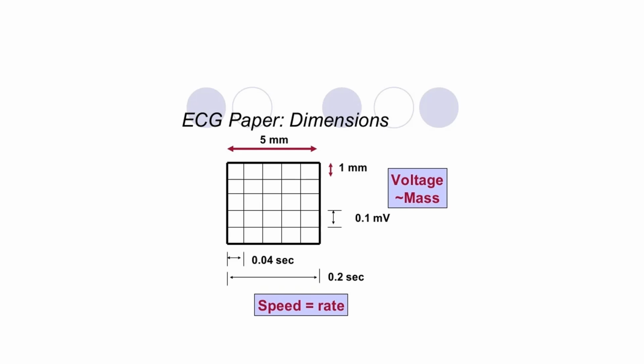Hello everyone, today we will talk about ECG paper dimensions and sinus bradycardia. So first I will start with ECG paper dimensions.